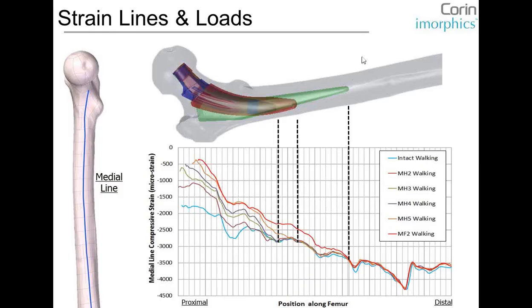And here are some illustrations at different time points of the leg bone and how it responds over time. The red represents bone deposition, the blue represents bone loss, and on the left-hand side is the Metafix, the long stem model. You get a lot more blue regions, which means a lot more bone loss, and fewer red regions, or bone deposition. Unlike the mini-hip size 2 on the right-hand side, there's a marked reduction in bone loss.